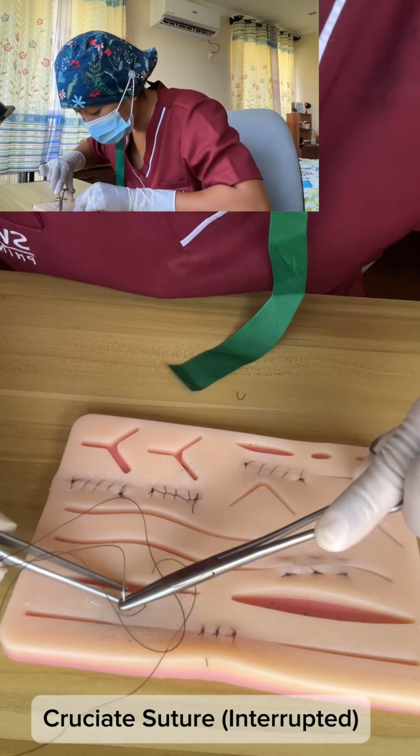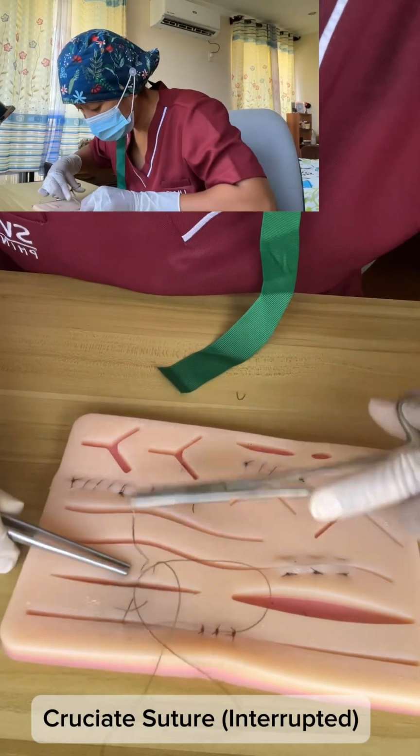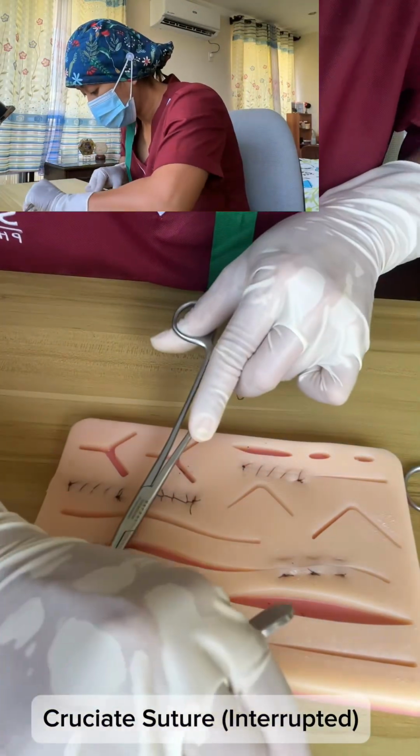It distributes tension over a wider area than a simple interrupted suture, which helps prevent tearing, and it creates a stable closure that resists mild movements and stress on the skin.